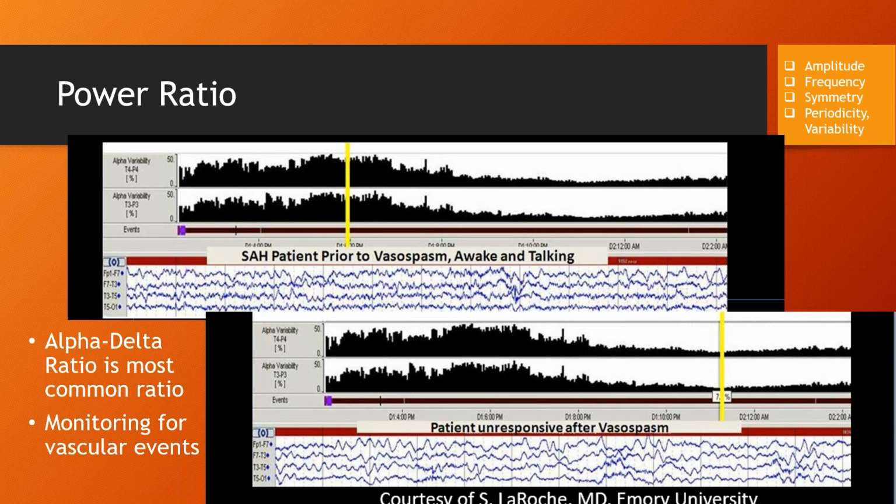And so the first case, if you look at the raw EEG, compare that to the second case, when they're side by side, it's easy to tell that the bottom one is much slower. Excuse me for that. If you imagine that this raw EEG, the change in the raw EEG occurs over a number of hours as it does, what we're looking at is changes that occur over probably 4 or 5 hours between the two, and that's much more difficult to see in the raw EEG.